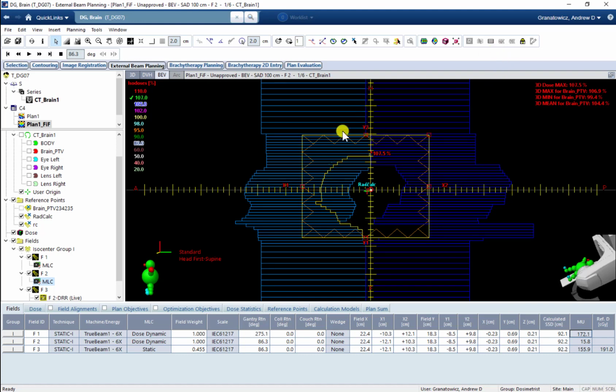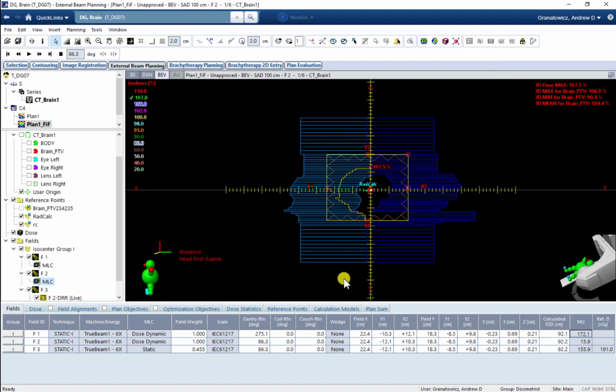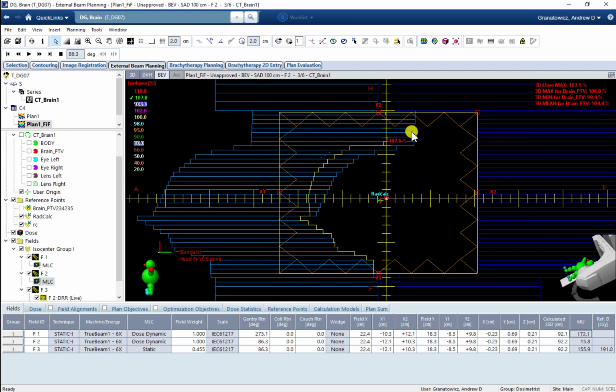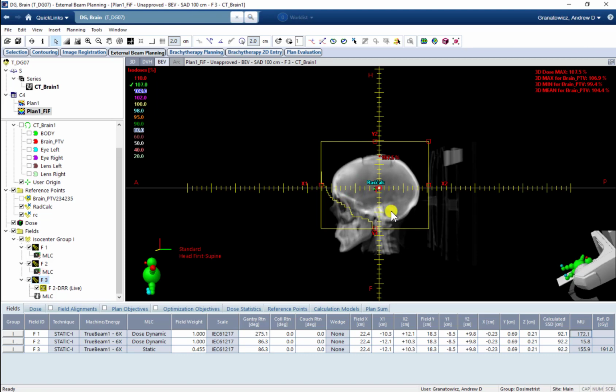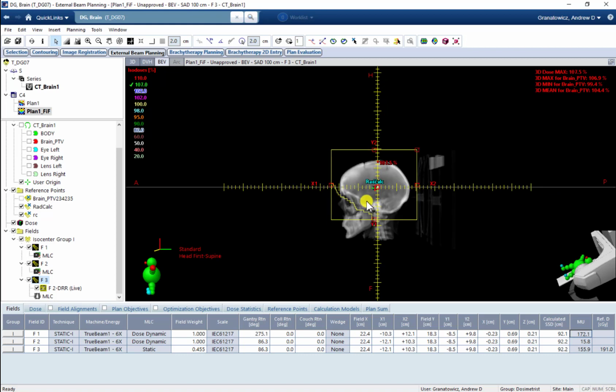It has to do with the carriage of the MLCs. If the entire bank of an MLC needs to move in order to incorporate the MLC pattern that you drew, it's called a new carriage group, and it just won't merge with your new field. Usually it's because you move an MLC more than 15 centimeters. So if I moved any of these MLCs, which it looks like these top ones I did, if we look here, this is 10, 11, 12. So we start at 12 cm, and then I added 13, 14, 15. So I added slightly more than 15 cm of travel. That's going to cause the whole bank of MLCs, or the whole carriage, to have to move, and when it does that, it just won't merge with your initial field. It's perfectly fine to leave that as is. It doesn't matter. We can leave that alone.